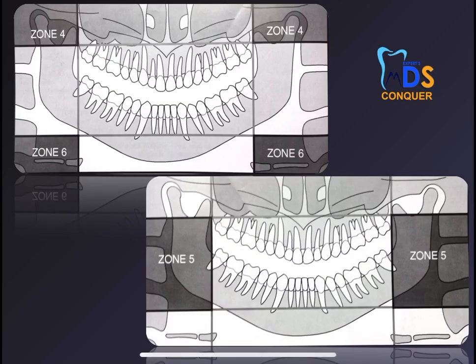Zone 4, you have to look for the coronoid process as well as the TMJ. Zone 5 is for the body of the mandible and the posterior area of the mandible on both sides, and also the distance between the cervical vertebrae and the mandible. Whereas zone 6, you have to look for the hyoid bone.